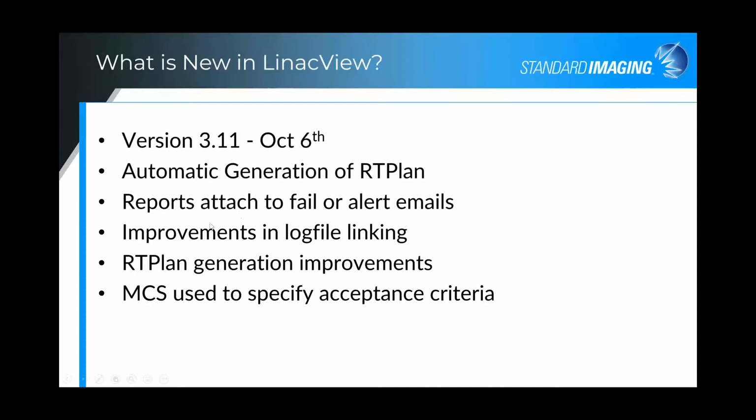And then our users have also asked for reports to be attached to the failure or alert emails. That way the users can go ahead and get additional information without ever going into and launching the software. We have other improvements in the log file linking and the RT plan generation, because this varies by Linac, and I'll go into some more detail concerning the log file linking.